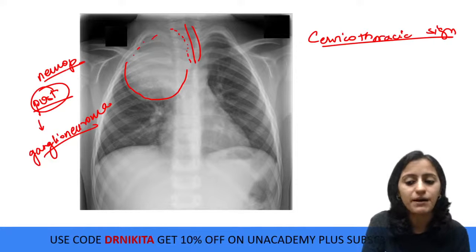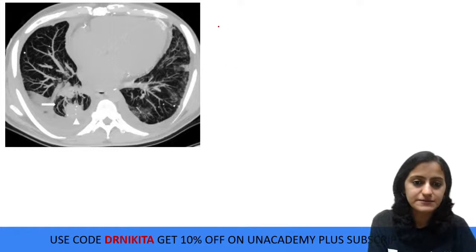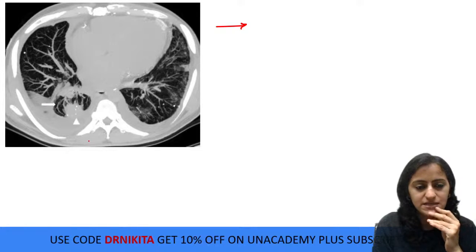Okay, so it is going above the clavicle, right? What sign is this? What is the next sign here? What sign are we seeing here? You have the arrows marked here.